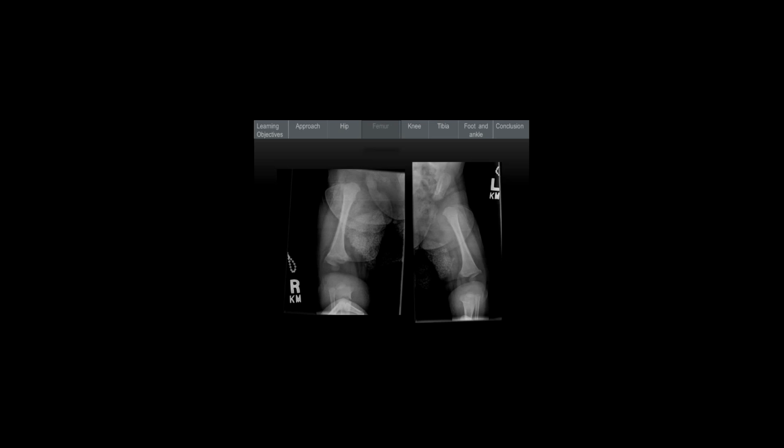If you pay very close attention to this case, you can actually see that the technologist who was helping take the x-ray covered with his or her finger an actual fracture of the right tibia. So there was a more significant fracture of the right tibia here, along with the other findings. This made it a very clear-cut case of non-accidental trauma or child abuse, which is always important for us to have a high suspicion for. It certainly occurs in every population.